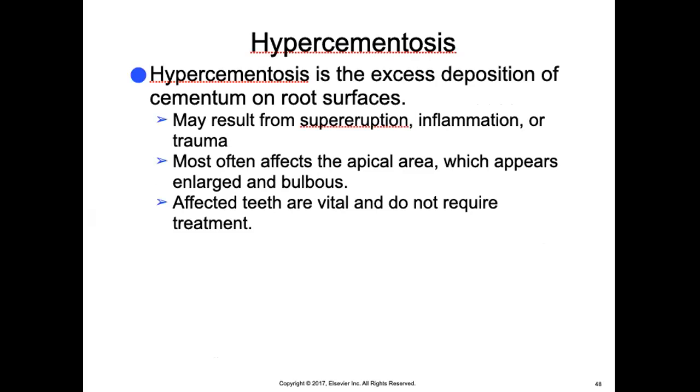Hypercementosis is the excess deposition of cementum on root surfaces. This may result from supereruption, inflammation, or trauma. These most often affect the apical area, which appears enlarged and bulbous. The affected teeth are vital and do not usually require treatment.